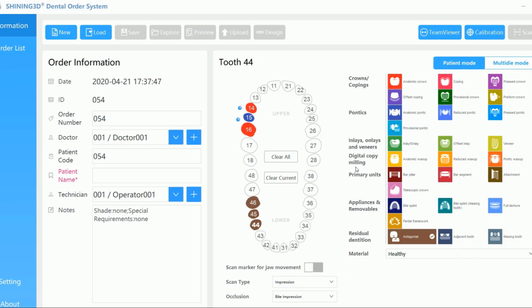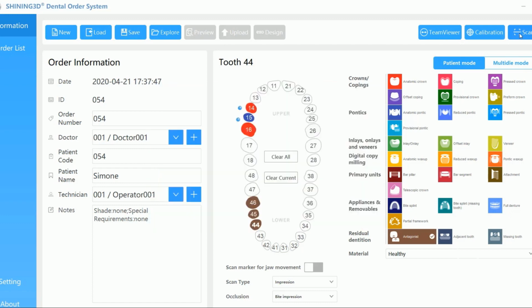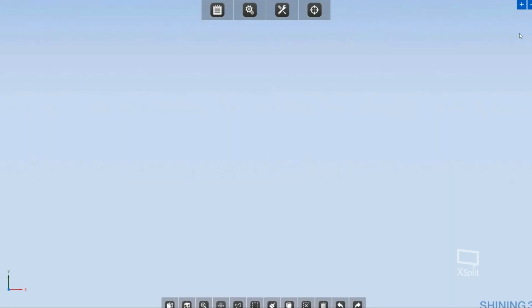Once I have set my job and checked that the job has been defined properly, I can save it. I have to set the patient name, my name, and once saved, I can start the acquisition process. I take advantage to switch on the webcam.